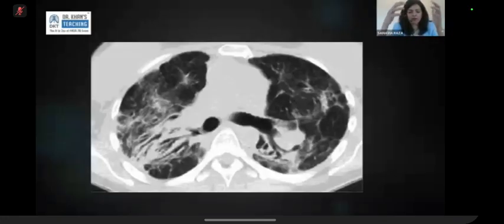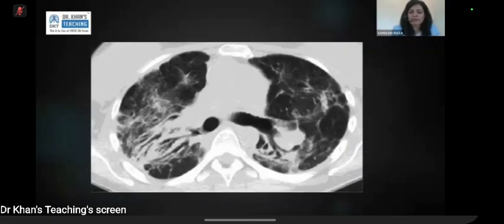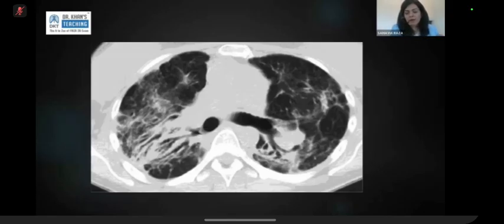So the bronchi are going to curve back and curve laterally. And all the architectural distortion, all the volume loss happens in that direction. And it's a very specific appearance. And once you see it, almost nothing else causes it. Especially if it's symmetrical. So if it's TB, it's going to be more irregular. When it's sarcoidosis, it's going to be more specific or more uniform. So that's what you can look for in terms of CT. So it becomes slightly more helpful.